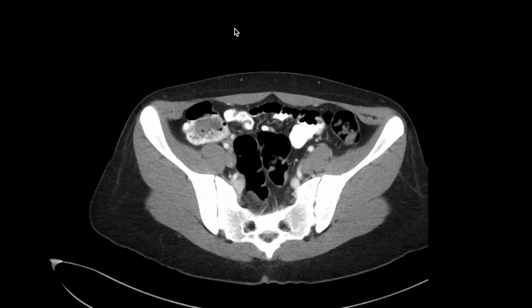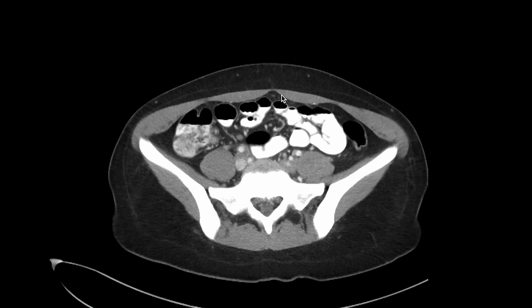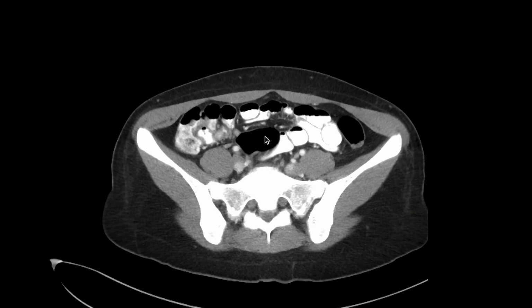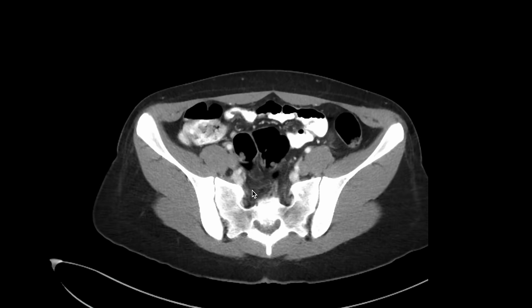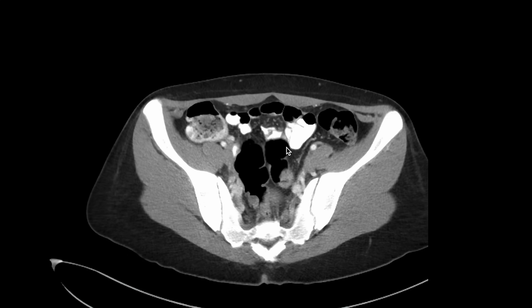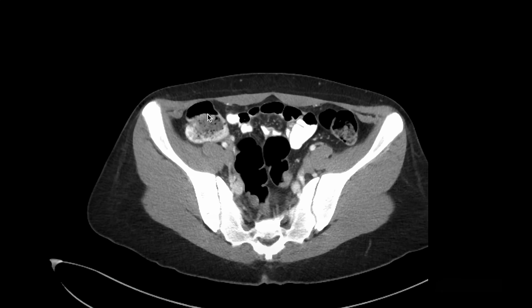And we also, in this patient, can see the appendix quite nicely here. And if we follow that up, you can see that it's blind ending. It disappears and doesn't lead to anything, aka it's blind ending, and it is the appendix. We'll talk about how to find the appendix every single time, when it's present at least, in a bit. But let's follow the colon first.